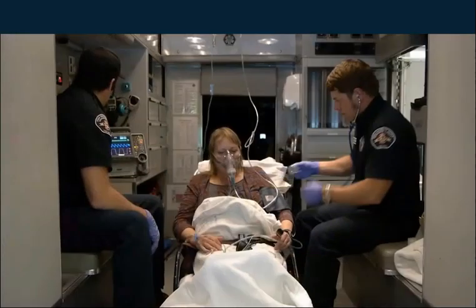If we see the waveform change, or we see numeric values get either on the high or the low side, what we have to be aware of is the body's inability to compensate for changes that are happening within the body. So as a real quick, easy way to measure metabolism, perfusion, and ventilatory status in our patients, we can use non-intubated capnography to identify that we have a normal respiratory rate and that we have an end tidal between 35 to 45 with a normal appearing waveform.